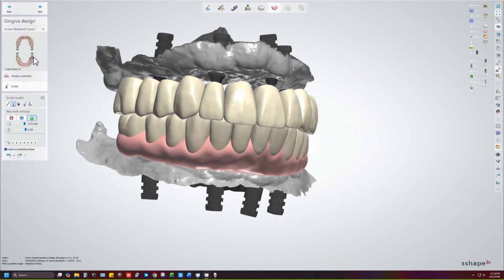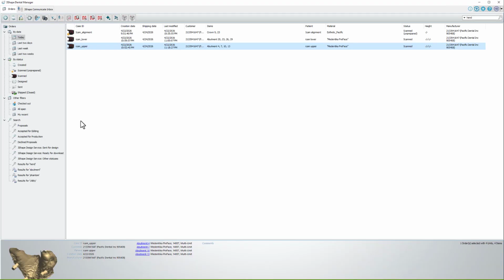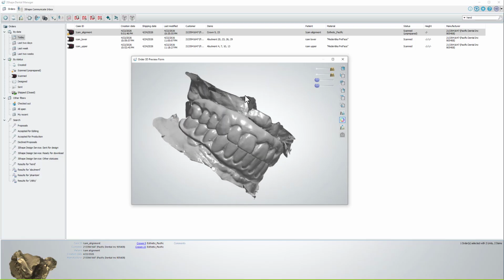Now we have the lower tissue evaluated or sculpted and ready to go. Let's load the upper, and now you can see right off the bat, the lower adapts better into the tissue. There's no more trough that was in his conversions.